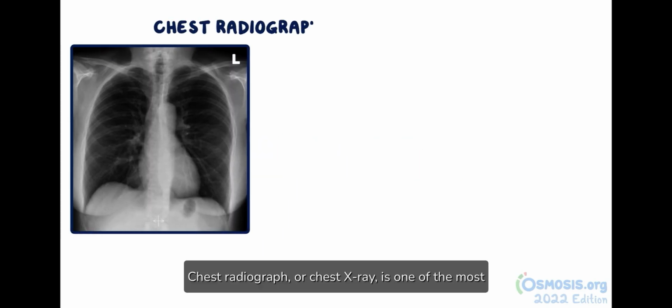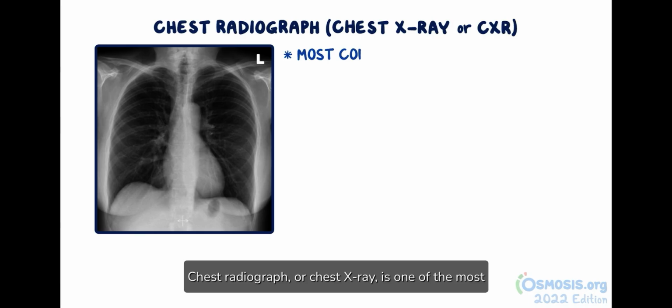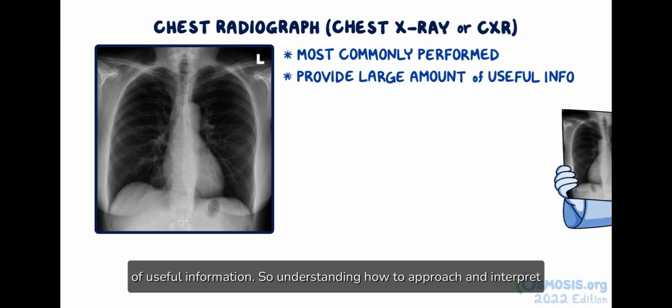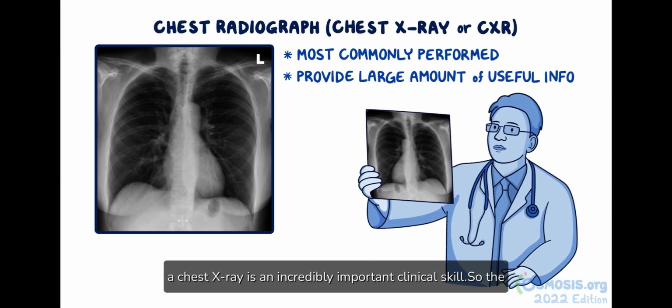Chest radiograph, or chest x-ray, is one of the most commonly performed imaging studies and can provide a large amount of useful information. So understanding how to approach and interpret a chest x-ray is an incredibly important clinical skill.